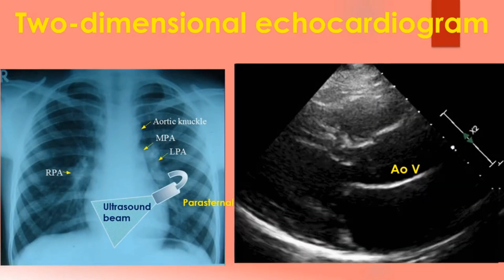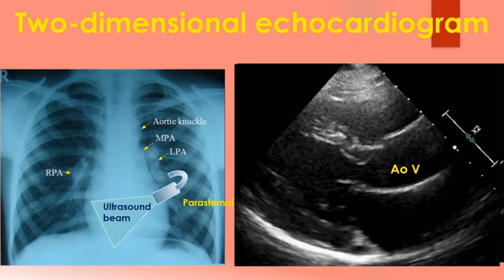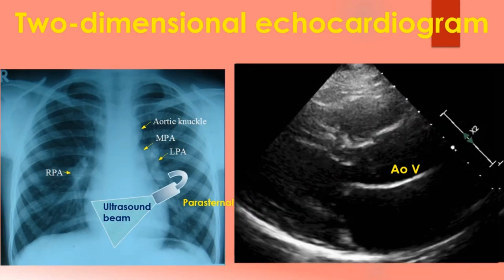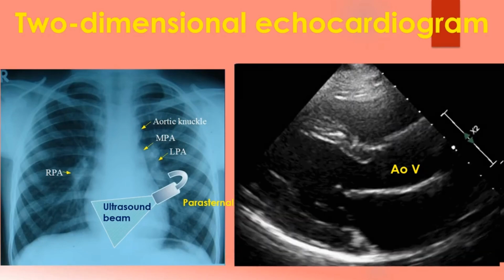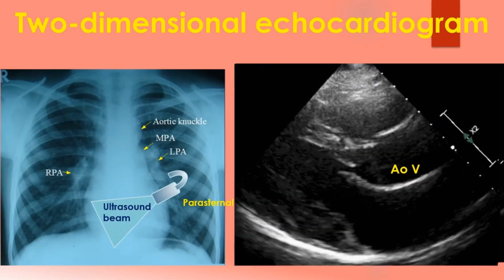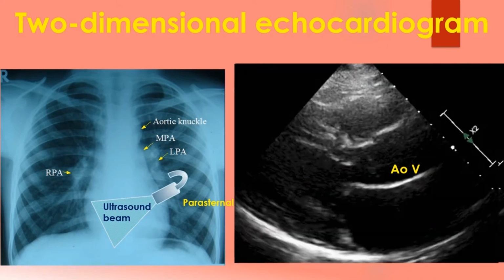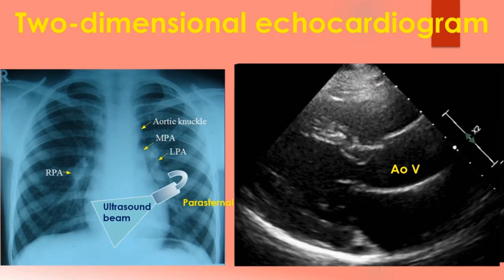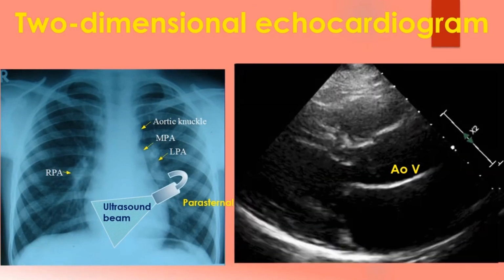During echocardiography, a transducer transmits the ultrasound beam towards the heart. Echoes received by the transducer from various structures of the heart are analyzed by the echocardiograph and a graphical representation displayed on the monitor. Location of the transducer is at the top of the image sector. Structures nearer to the transducer are shown at the top of the image and those away from the transducer at the bottom of the image.